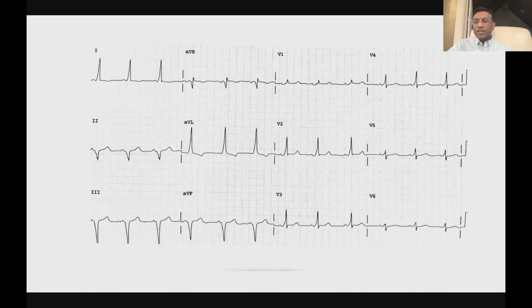Any takers for this first tracing? And perhaps I would ask that someone volunteer quickly so we don't spend too much time waiting on someone to volunteer. So just jump in.